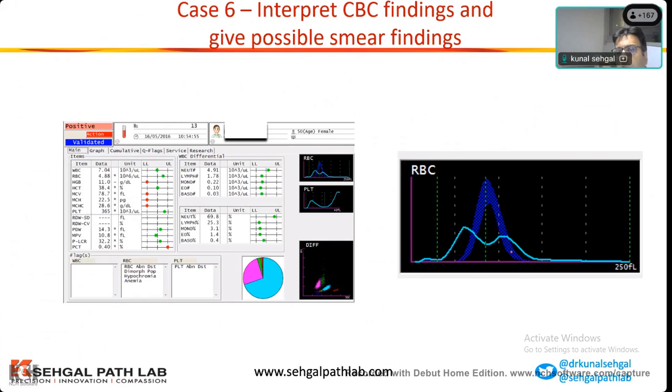Yes, dimorphic because the two peaks are there, iron deficiency, a bimodal peak. Now you have to tell me only one thing in this case. You have the hemoglobin. Hematinics, iron deficiency treatment. Exactly, the hematinics. It is the same case which we discussed on the three-part counter. The same logic and principle applies here.